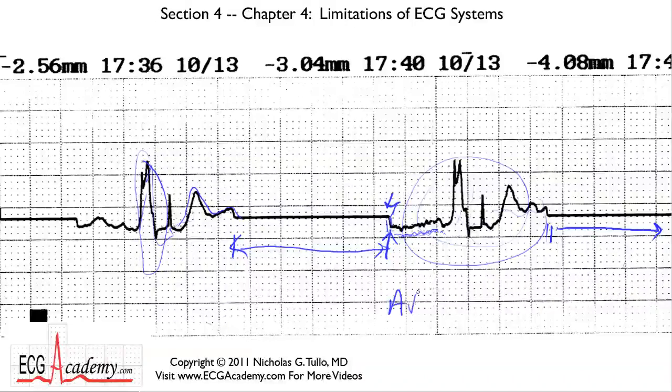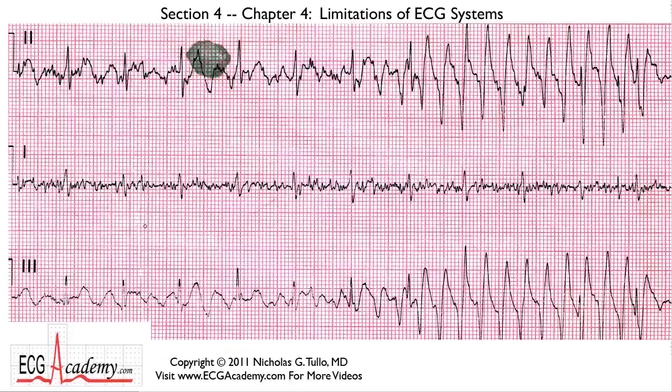Artifact is the word I like to use when it's not real. The heart isn't really doing this. It's just that the electrical circuitry is showing you something that doesn't really exist. I'm going to give you another example here. This is the last one. This is from my files.